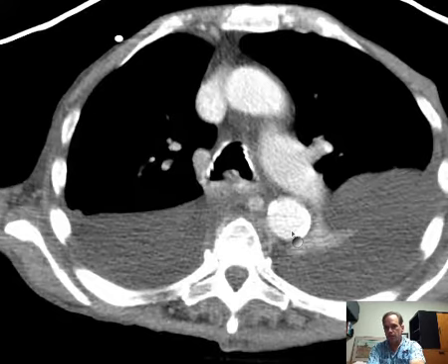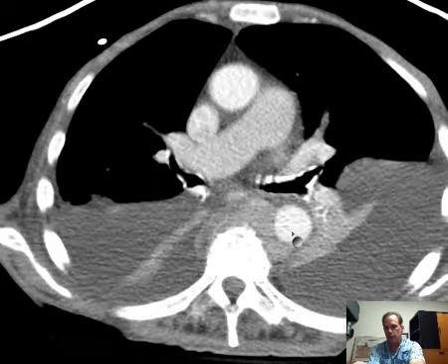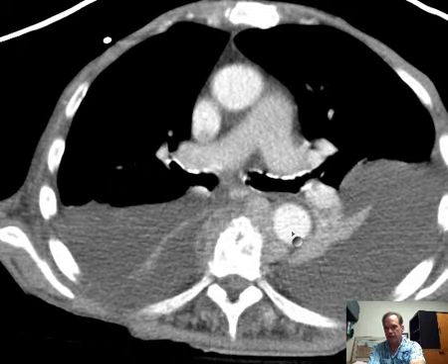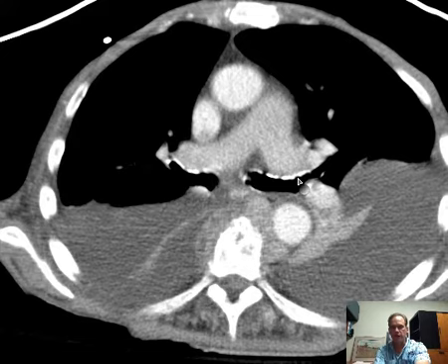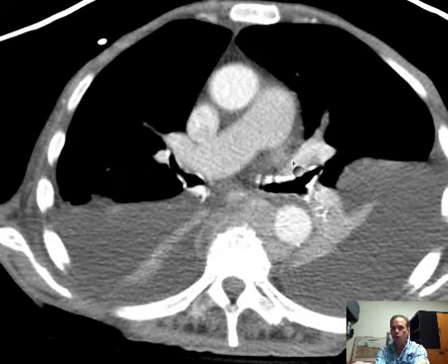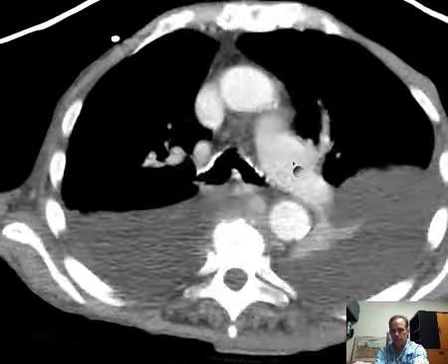Let's take a look now at the main pulmonary artery. And I distinguish the main pulmonary artery in that phraseology because it's important to distinguish it from the right and left main pulmonary arteries. And it's very important in anatomy and in radiologic reporting that your nomenclature be absolutely clear and leaves no question as to specifically what anatomic structure to which you are referring.